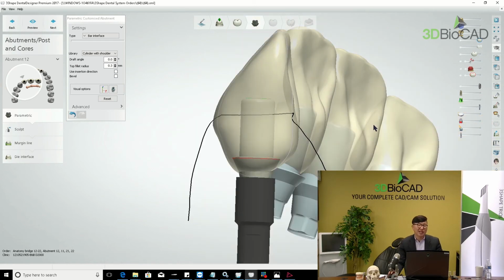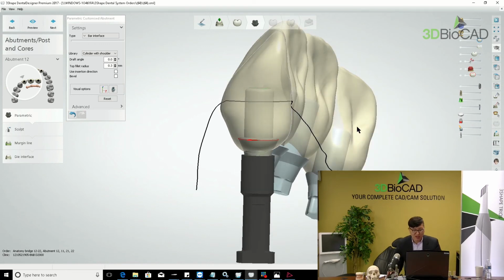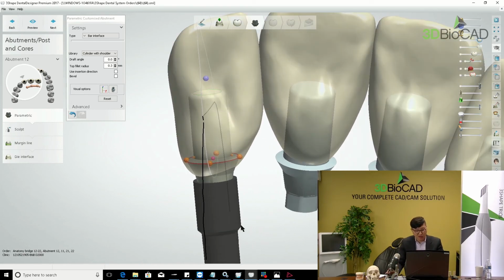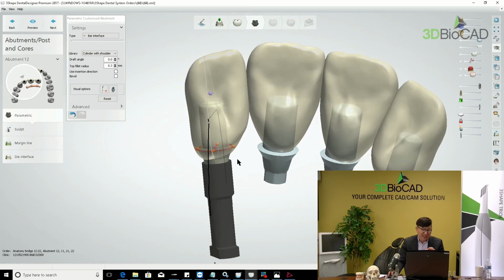As we know, a titanium base of course works fine, but it is only 4 or 5 millimeters in length. With this one we can go a little taller, and the temp cylinder has the anti-rotation notches there. So again, I just measured the temp abutment's size and designed it myself here.